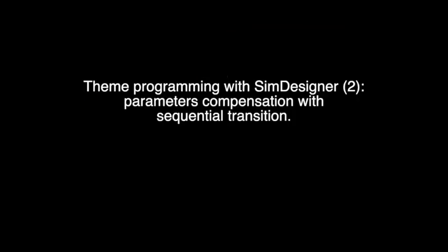In this video, let's look into parameter compensation with sequential transitions. It is demonstrated with theme programming, but this concept is applicable in scenario and handler programming as well. The video is theme programming with SimDesigner, parameter compensation with sequential transitions. The purpose of sequential parameter transitions.